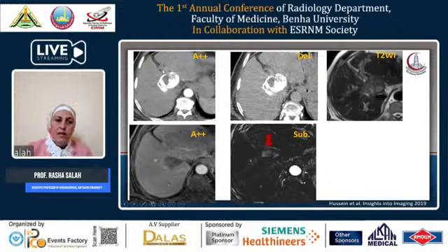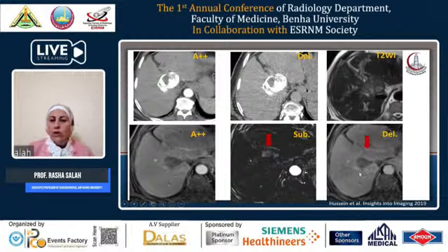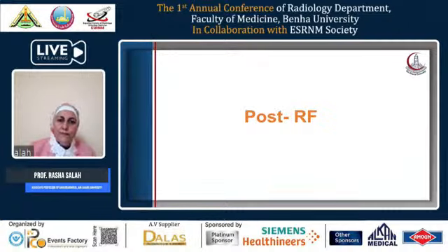And if we compare it with the CT, we can notice that this enhancement partly corresponds to the area of non-lipiodol condensation. And on the delayed image, we can see that this part in particular shows washout compared to the early arterial phase. And this is the superiority of MRI to assess post-treatment changes for assessing residual tumors.